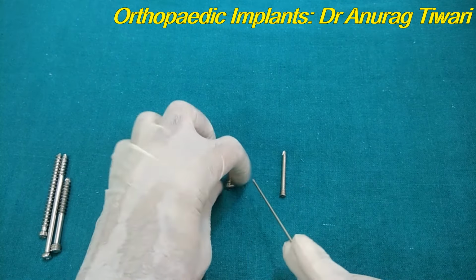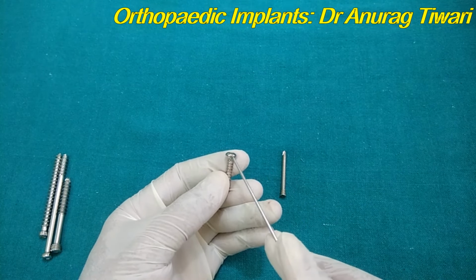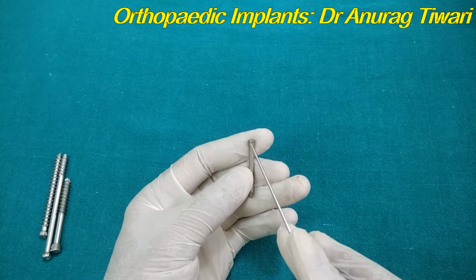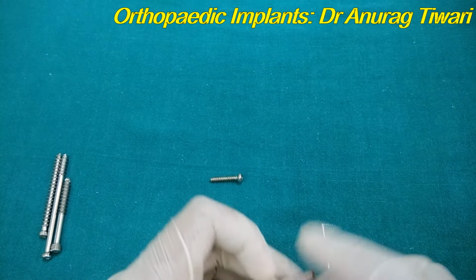You can see here that the simple screw will not have the thread over the head of the screw. This is the head of the screw. Whereas in the locking screw, you can see they have the threads up to the head so that the screw gets fixed in the locking plate.